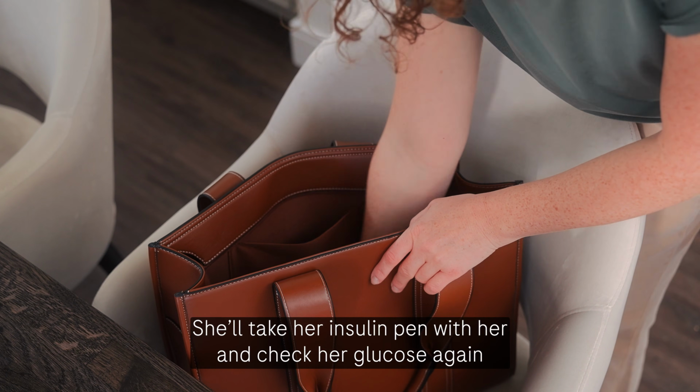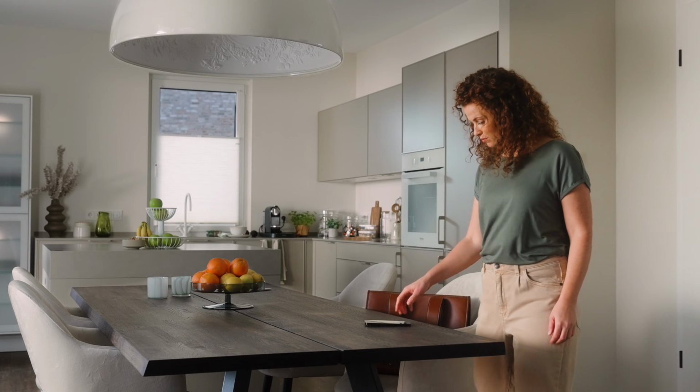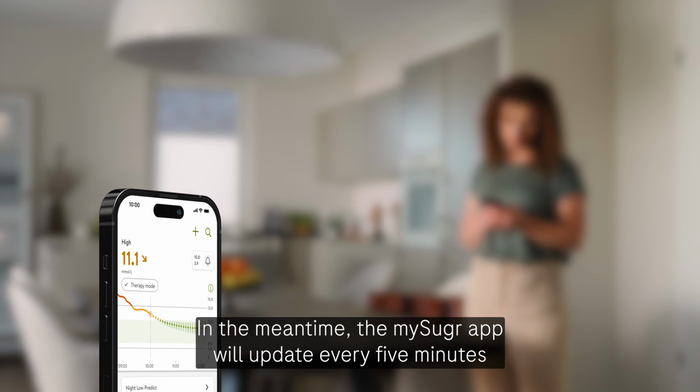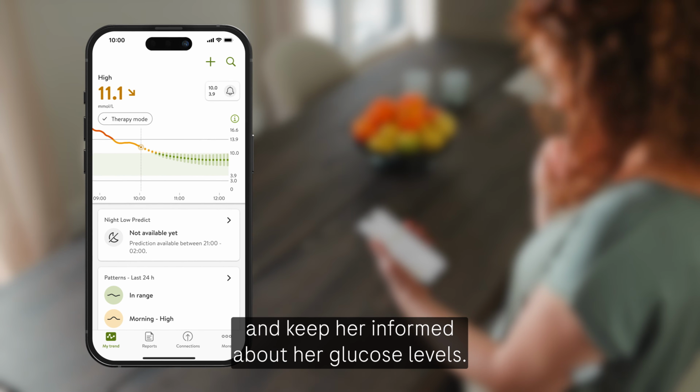She'll take her insulin pen with her and check her glucose again when she gets to her brother's house to see if correction insulin is needed then. In the meantime, the mySugr app will update every 5 minutes and keep her informed about her glucose levels.